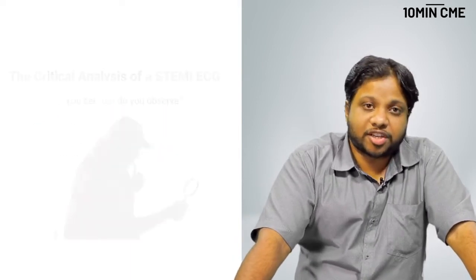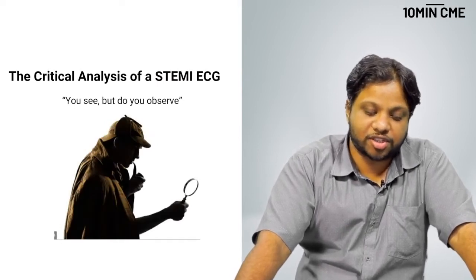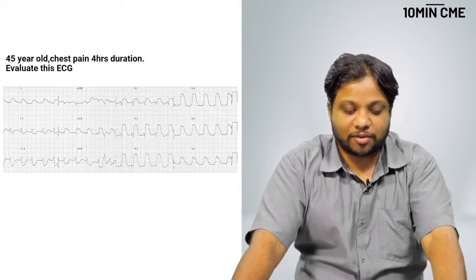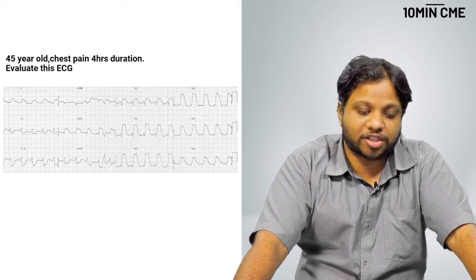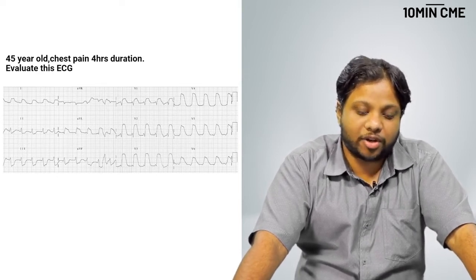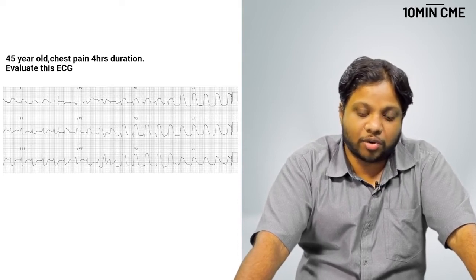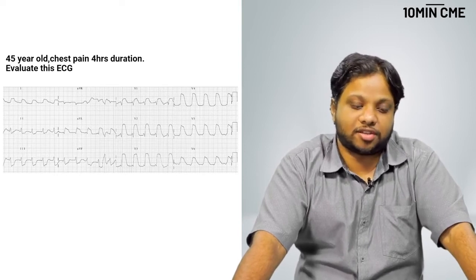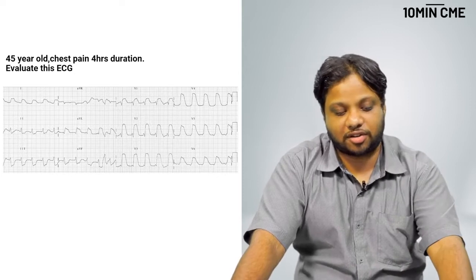The topic for today's presentation is the critical analysis of a STEMI ECG, and the title is "You See but Do You Observe." Now this is from, as you see, Sherlock Holmes. This is a 45-year-old who is having chest pain for 4 hours duration. I want you to see and evaluate this ECG. It would be helpful if you take a piece of paper and note down your findings, all the possible information that you can get from this given ECG. And let's see how it improves at the end of this presentation.